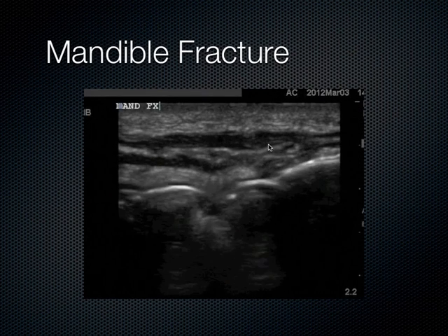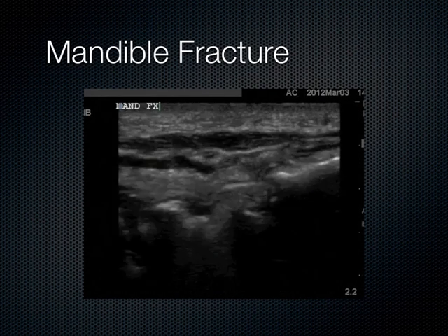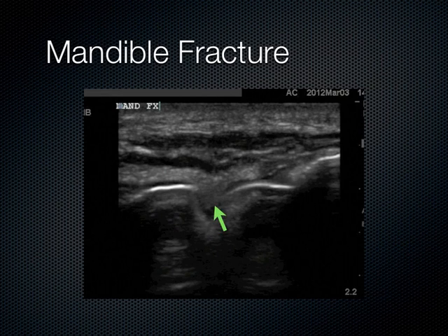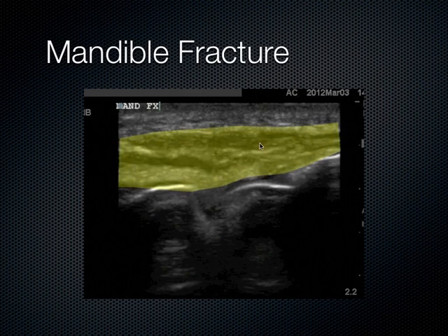And this is a comminuted mandibular fracture, which means it's in different pieces, and the disrupted cortex is located at two different places, marked by those green arrows. You can see accompanying superficial layering of fluid from all that soft tissue swelling anterior to this whole process. Many times we see a lot of edema or even hematoma formation above these fracture patterns. So one part of the mandible is here, then there's a step off, then another bone here, and then the other bony landmark is over here. So this is comminuted, broken in two different places.